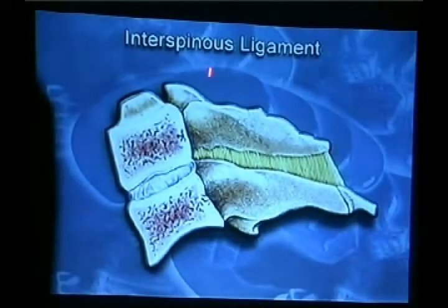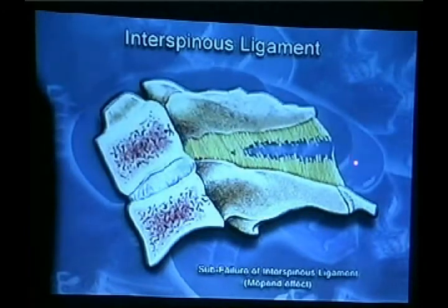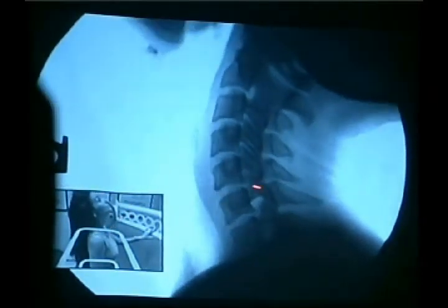Another little avulsion there. Interspinous ligaments are the ligaments in the back of the neck again. When they tear, they separate. And that's where we can pick this up beautifully. And you'll see this girl, her interspinous ligaments are so torn, she almost dislocates her facets right here. It almost pops over on some of these lower ones. You can see the disc angles, they touch, and then these open up, and if she goes a little bit further, she would probably dislocate her neck. You can just see it sliding back and forth.